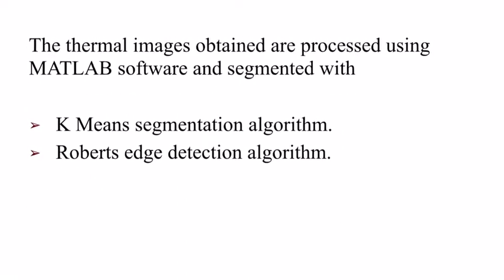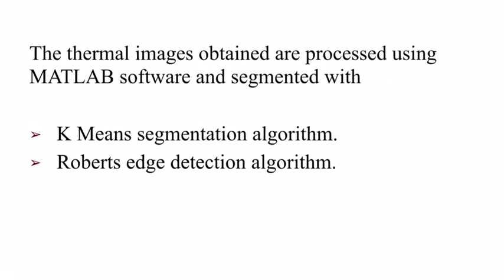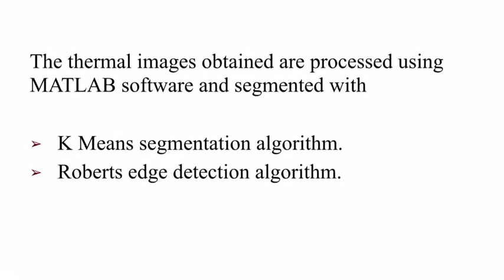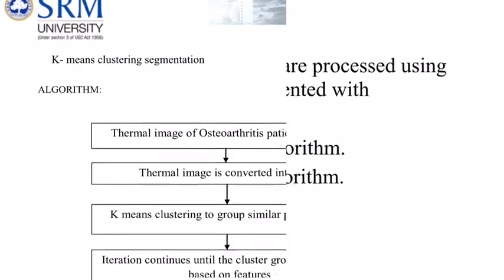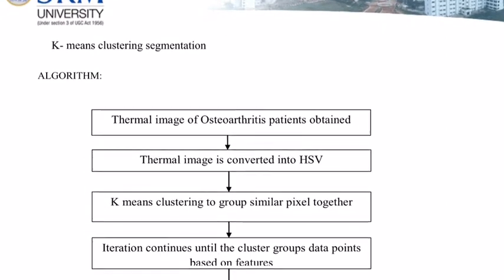The thermal images obtained are processed in MATLAB software and segmented using the K-means segmentation algorithm and the Roberts edge detection algorithm, and their outputs were compared. The flowchart of the K-means clustering algorithm can be seen here.